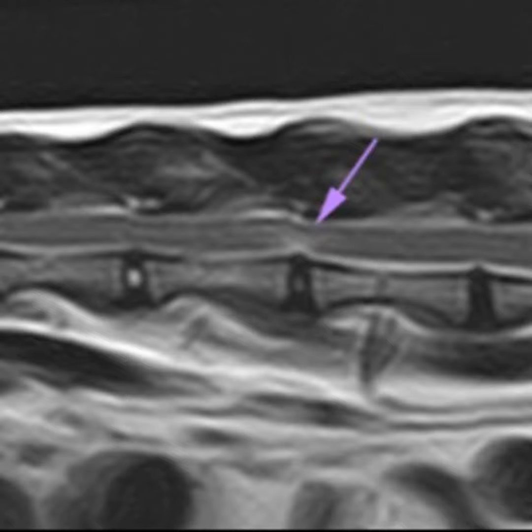So for the type of disc herniation, 50% of cats were diagnosed with the acute non-compressive nucleus pulposus extrusion, 28% with disc protrusion, and only 21% with disc extrusion. No intradural, intramedullary intervertebral disc herniation was diagnosed.